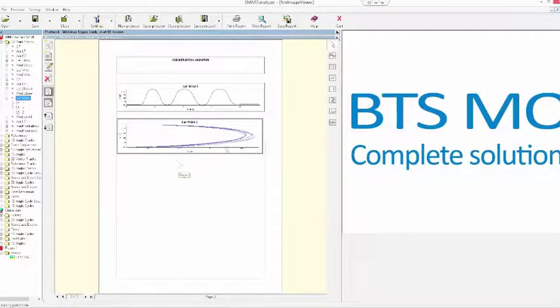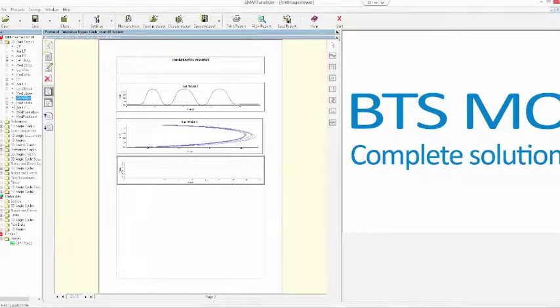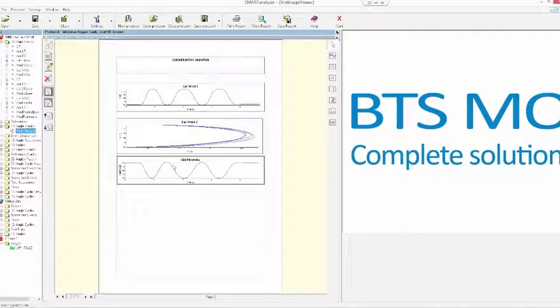Okay, now I can also add another plot containing, for example, the 1D angle that we have computed the previous time. So the angle will be contained into the 1D angle tracks. Okay, so this is the result. For example, again, we have the angle versus time. So this is the angle in the time domain.